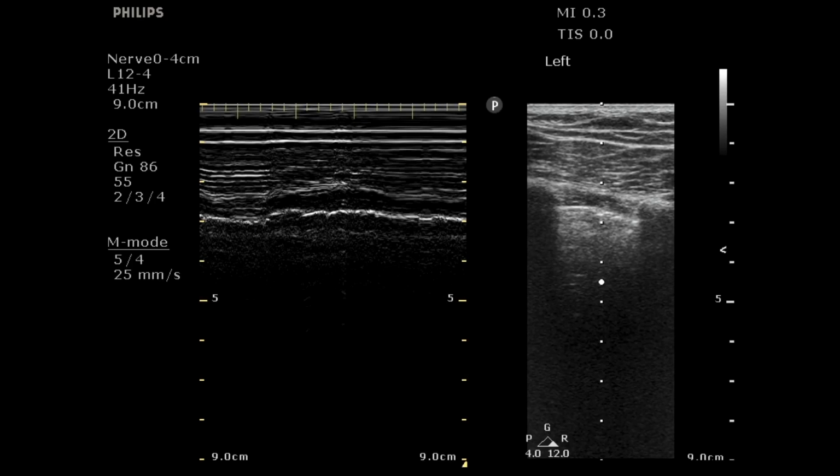And so when you think about this, when you look at it at one rib space, that really only rules out pneumothorax in one rib space. But I suspect if they were stabbed in the chest on the left side and they had a pneumothorax, it's probably going to be pretty decently sized, and I probably should see it in more than one rib space. And certainly if you have a tension pneumo, I should see it in multiple rib spaces along the anterior fields. So while this image alone doesn't rule out a small, tiny pneumothorax, I think that it's probably helpful in lowering the differential diagnosis for a tension pneumothorax, right?